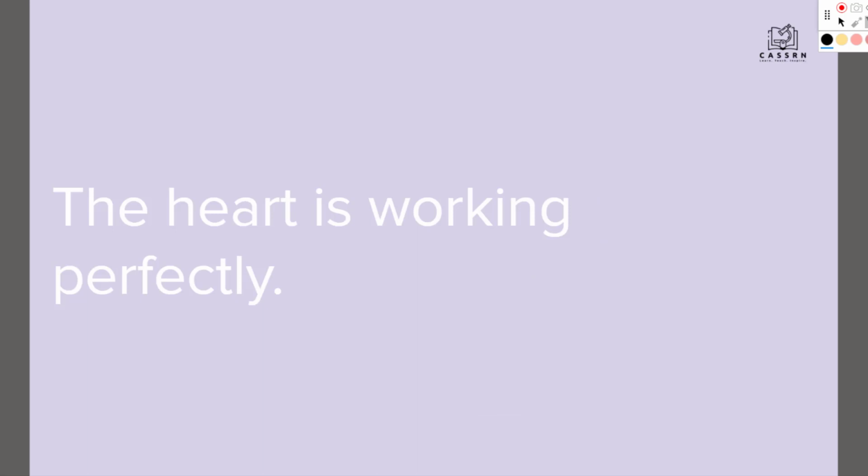So essentially in normal sinus rhythm, the heart is working perfectly. And it's really important that you're very familiar with this, because if you don't know what normal looks like, it's almost impossible to recognize abnormal.